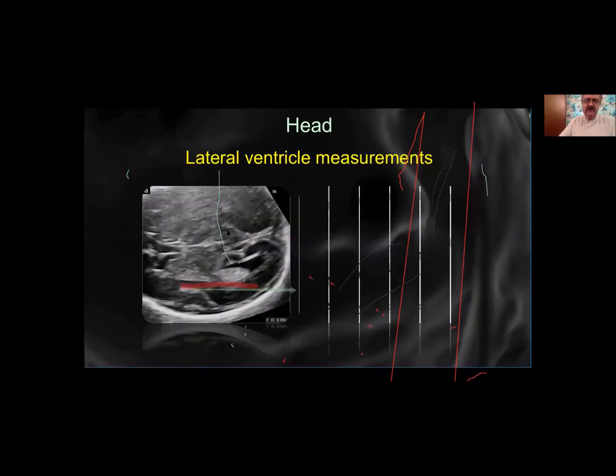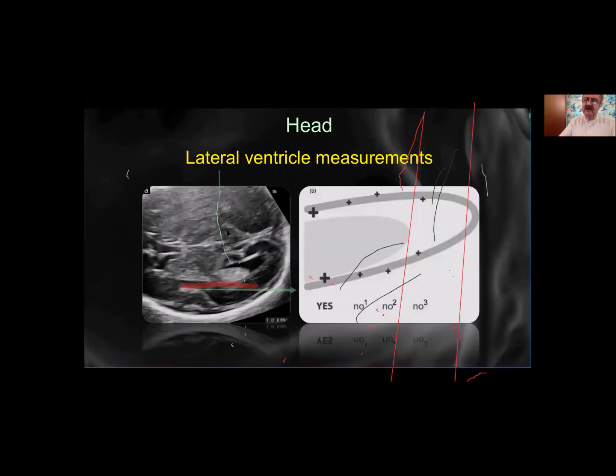And what will you do? The first thing is to make sure that it's measured correctly. So look at the image, and you must become familiar with this. Have they got a true image which shows the cavum septum pellucidum, the occipitoparietal sulcus, and the lateral ventricle and choroid plexi, and have the calipers been put inner to inner, and then has the measurement been taken? Then you will say, okay, measured correctly, and it's a reliable finding.